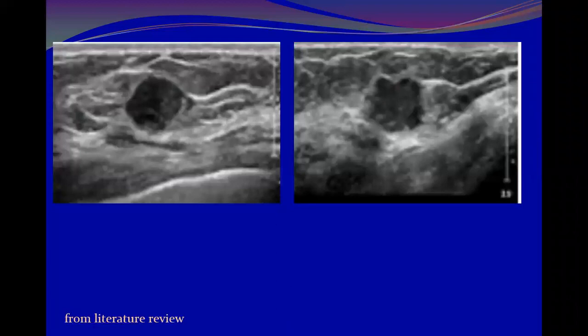Can you tell me the difference between these lesions? What is the difference between the two lesions? I think the angle. Who is talking? Suhair. What is the angle?